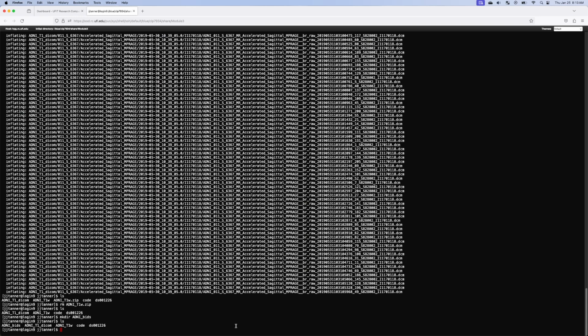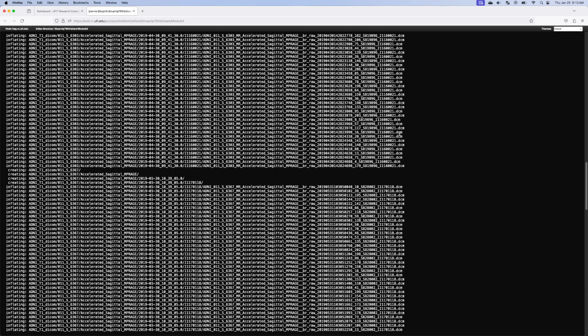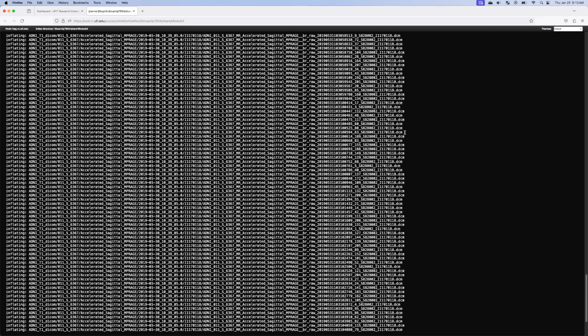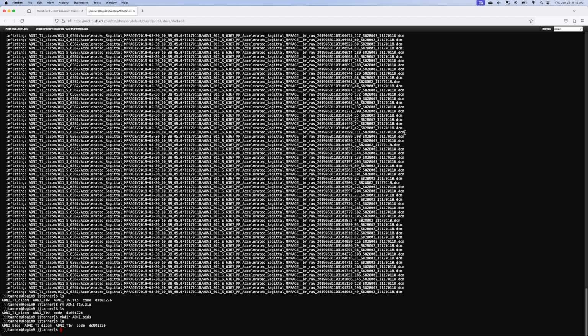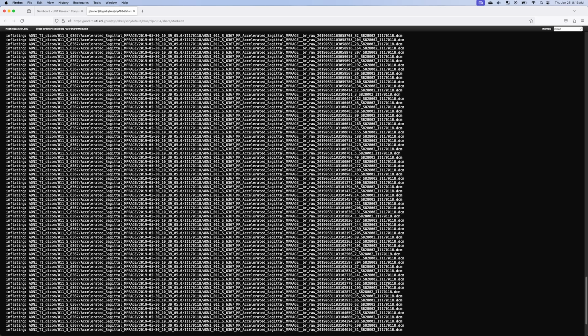And what we want to do is, if we notice, we extracted these files. These were all .dcm files. Those are the dicom files. These are what come from the MRI scanners. And so what we want to do is convert these into NIfTI files, which will just give one file per subject, so we don't have to deal with all of these many inputs.